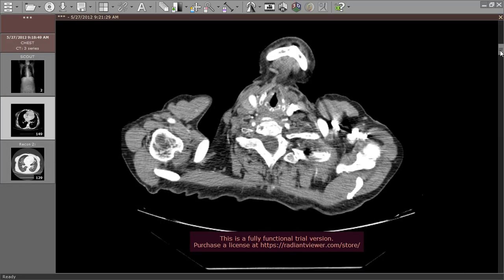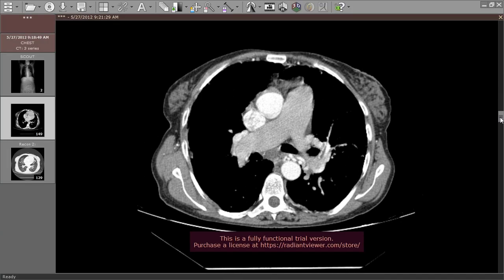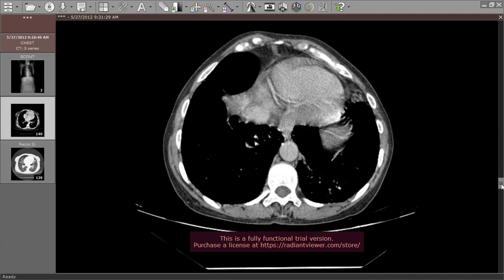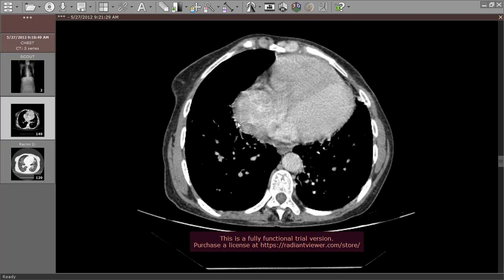Case number 2. This was a patient complaining of chronic dyspnea and recently hemoptysis. You can see, of course, the cardiomegaly. It has a right predominant type, dilated right atrium, dilated right ventricle. It is nearly equal to the volume of the left ventricle, and as we said, we have this straightened interventricular septum.